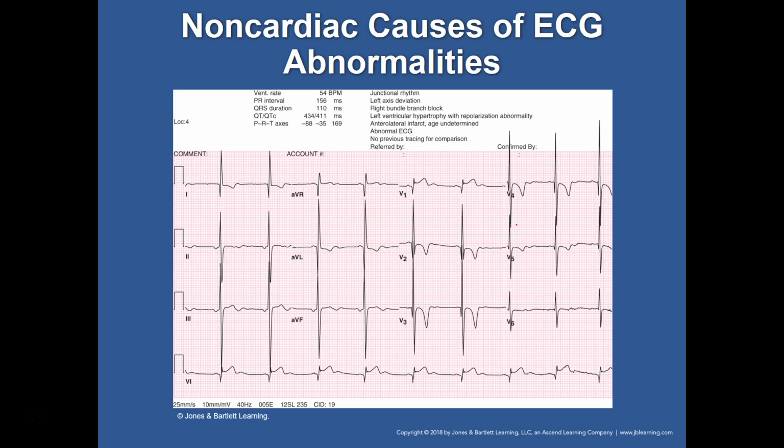So remember, when we talked about ventricular abnormalities, when we talked about bundle branch blocks, that's what we were talking about, right? Well, a lot of this fits within, not bundle branch blocks, it'd be a long day already. Ventricular hypertrophy, when we talked about chamber enlargements or something like that, chamber size, we saw that, right? We talked about tall peaked R waves. We talked about deep S waves. That's what we're looking at here. So we see these tall R waves, these deep S waves, and it's because of all of that hypertrophy caused by the cardiomyopathy.